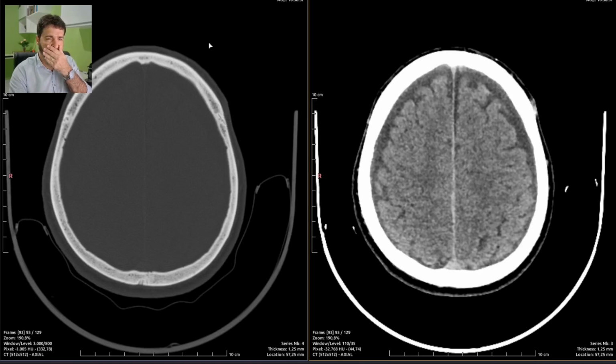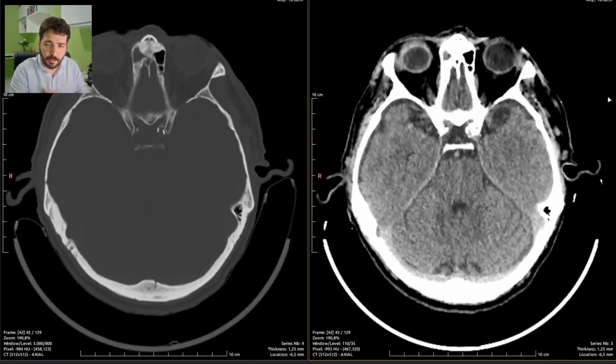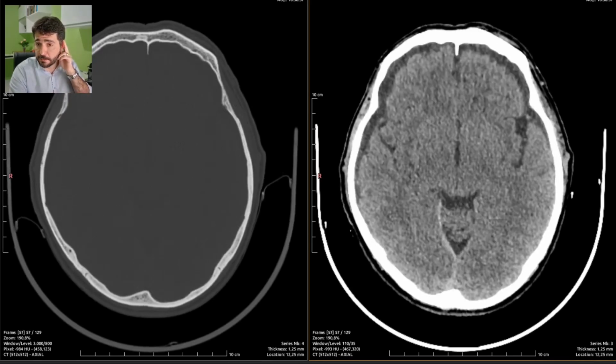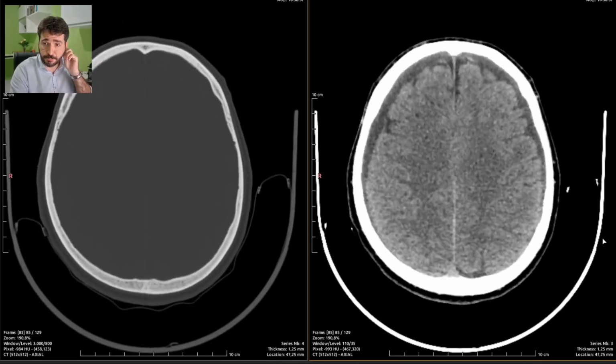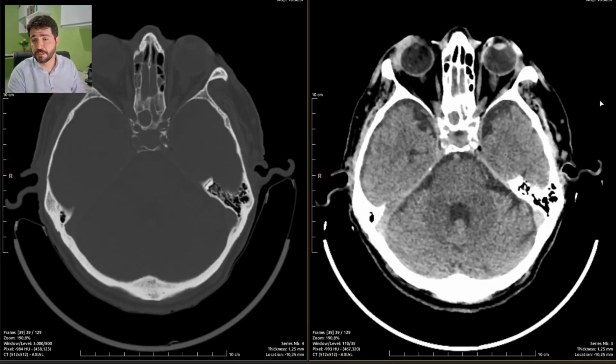Oh, excuse me. So this is 0.8. So this is a usual cause of chronic headaches and loss of some neurological functions and worsening of dementia.